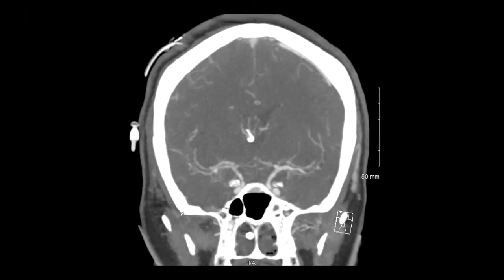And when you start seeing the vessels, initially we saw a normal vessel. The only thing we saw was that aneurysm. But now when you start seeing, see how they are more ratty, irregular narrowing along the course of the vessel. And this would be the distribution of the MCA. But when you look at the ACA, you can hardly even see it. It's really, really narrowed in bilateral A1 segments. But in this image, it's hard to see the A2.